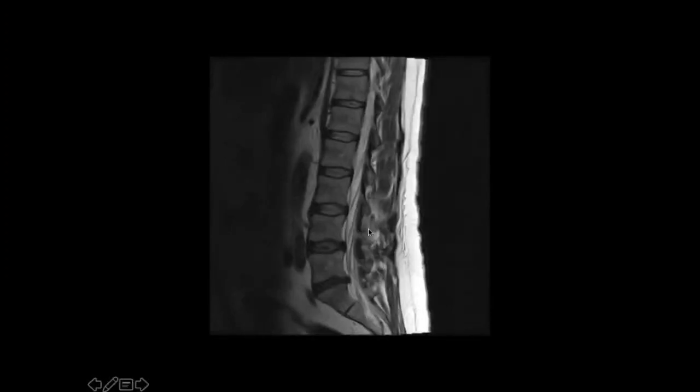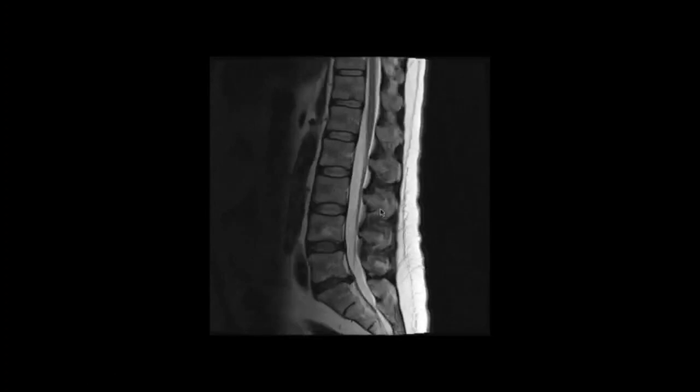Whether there's any sort of disc protrusion, what's happening to the spinal canal, whether or not this is causing any significant canal compromise. I'll come to that in a minute, but this is what needs to go into the report. Then we're looking at, is there any sort of collapse of the vertebra itself? What's the marrow signal like? For that, you would look in the T1 weighted image. This is a T2 weighted image. That's again, a T2 would be able to tell you something about the marrow signal as well.